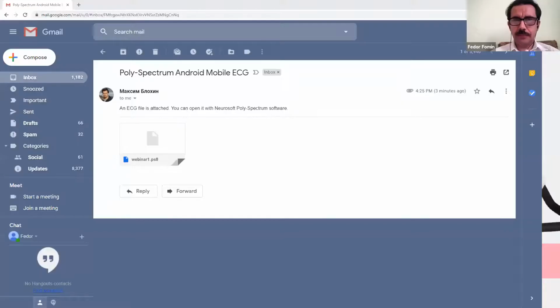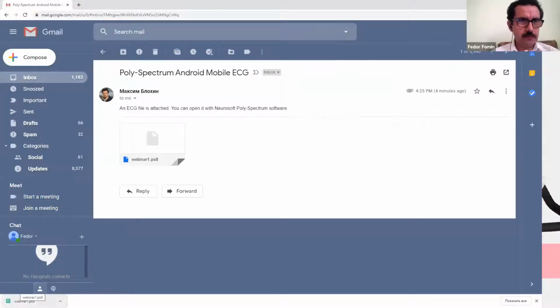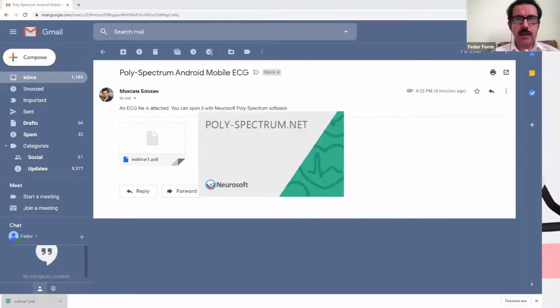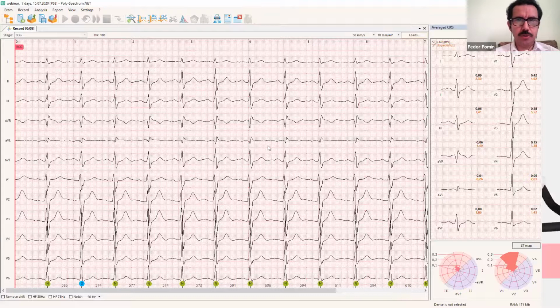Yeah, hello everyone. Hope my sound quality is okay. So first of all, I need to share my screen. So now you should see my Gmail box with a file arrived from Maxim. I just need to download it to my folder, any folder actually. Then I'm clicking this file, and it's just a setting that system recognizes that this is ECG file that should be opened by the polyspectrum.net software.